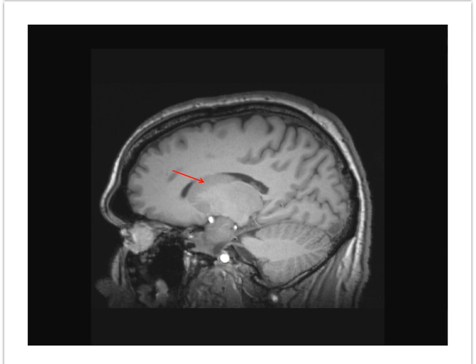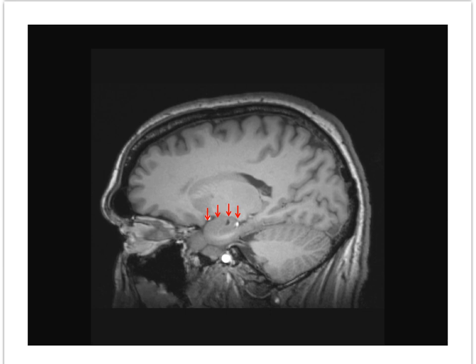Once again, we see a portion of the body of caudate nucleus indenting the lateral ventricle. Parahippocampal gyrus bends back on itself and forms the characteristic configuration of the uncus. The anterior putamen is indicated by this arrow, and it is separated from the head and body of caudate nucleus by the anterior limb of internal capsule.